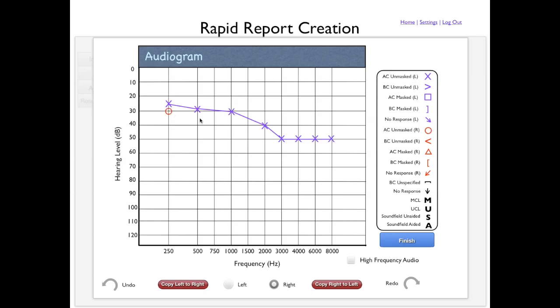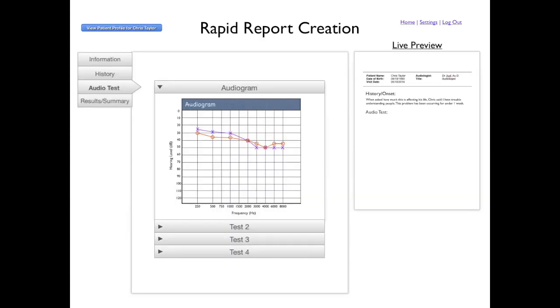This software is also handy because it will give me a summary of the audio upon finishing, which goes directly into the report. This goes true for all the other audio tests as well, so I can simply run my tests and have the information automatically populated into the report. I've never had to hand type a long report since I've been using this software.